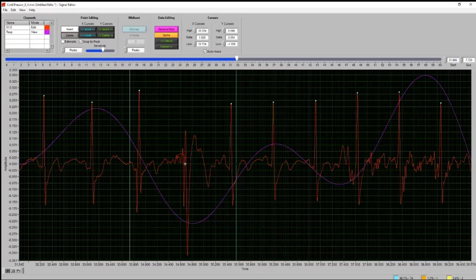If we can see that there's just been an error made by the algorithm, for instance, that it's just placed a beat in the wrong spot, and let me just get this correctly here. So there you go. Let's just say it placed it down here on the actual data. That's the instance in which we're like, no, there was just an algorithmic error. I can actually see the ECG. I'm going to delete that, place it in, and then it will not count towards part of the 10%. It's an actual beat that was just incorrectly identified there.